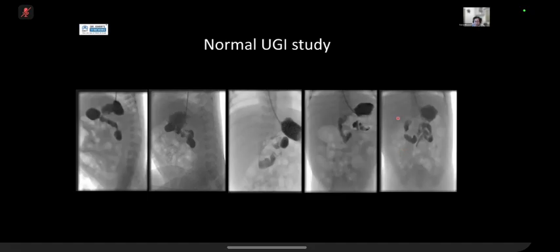The important thing to note here is, as some of these have shown, particularly the last two pictures, if you're on a supine view and you want to make sure your DJ flexure is in the right position, you have to have the patient quite well centered, seeing both costophrenic angles, okay? Because you can very easily make this picture look normal if you rotate the baby. In a true malrotation, you can always make something look normal when it's abnormal. So just be mindful that you always have your costophrenic angles in a well-centered child.